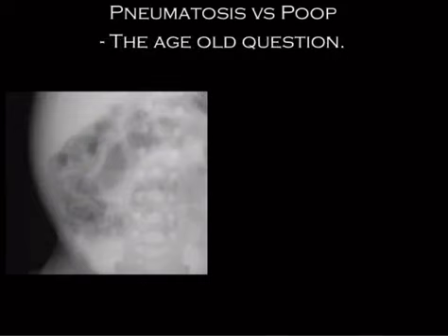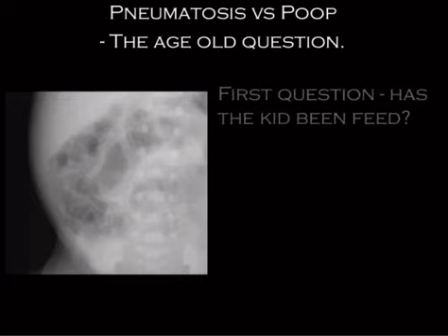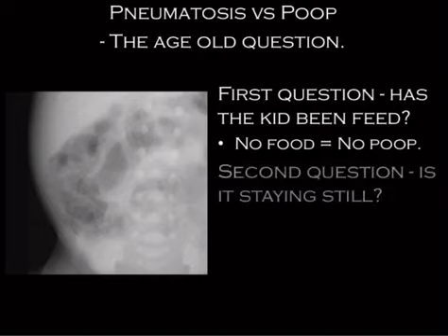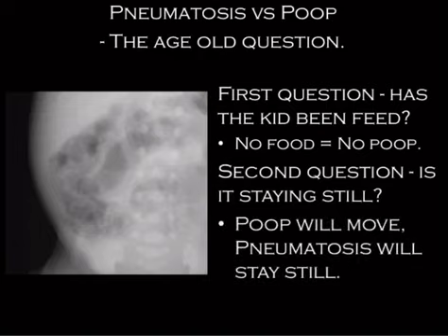So mentioned this once before, pneumatosis versus poop. The age-old question, remember to ask, has that kid been fed? No food equals no poop. And then watching it on serial exams, does it stay still? Poop should move.